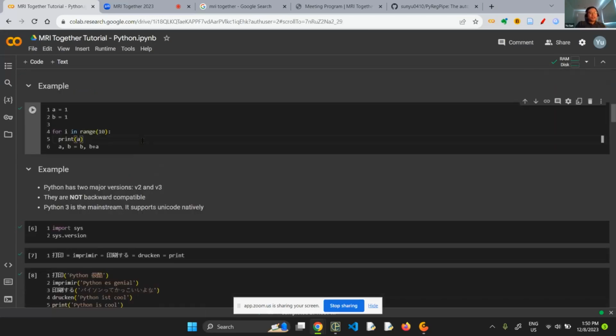All right, so another piece of code is here. You can say A equal to 1, B equal to 1. Then for I, which looks like some sort of iteration, we can print A. And then we replace A, B with B and then A plus B. So basically A, B start with 1, 1.